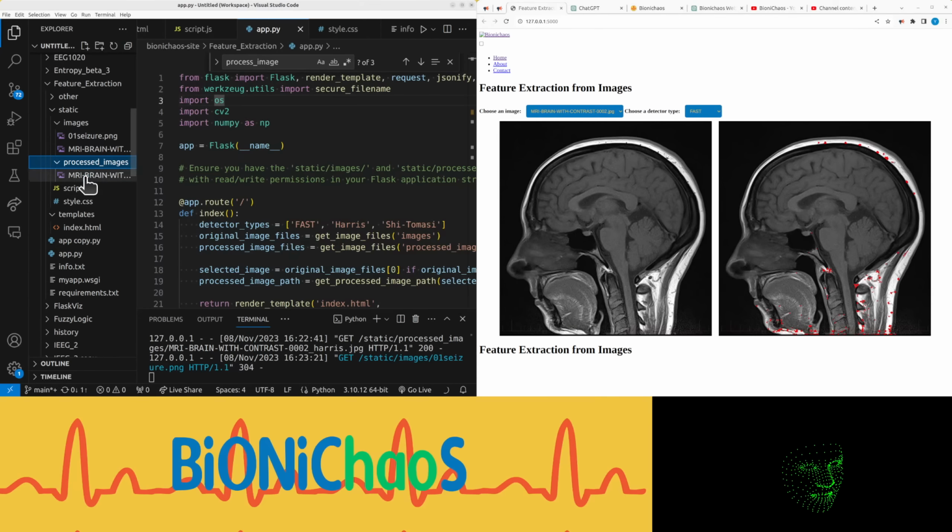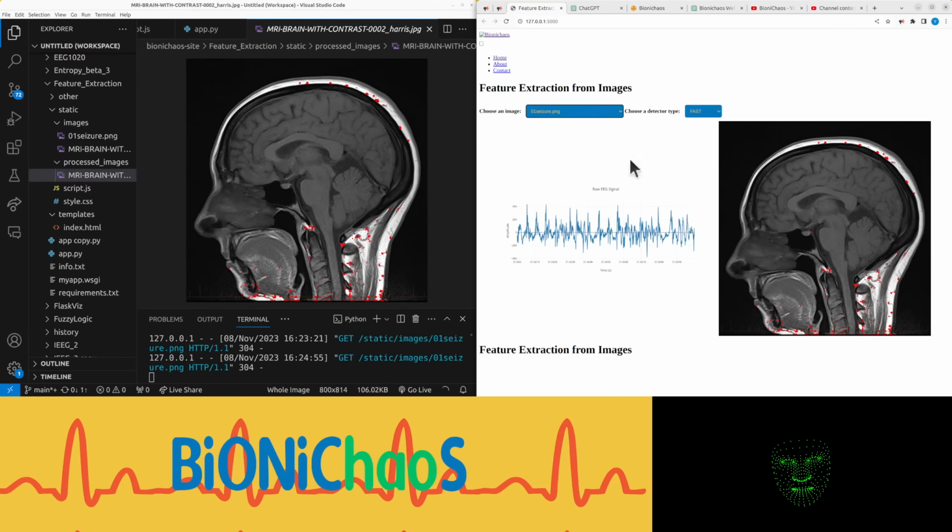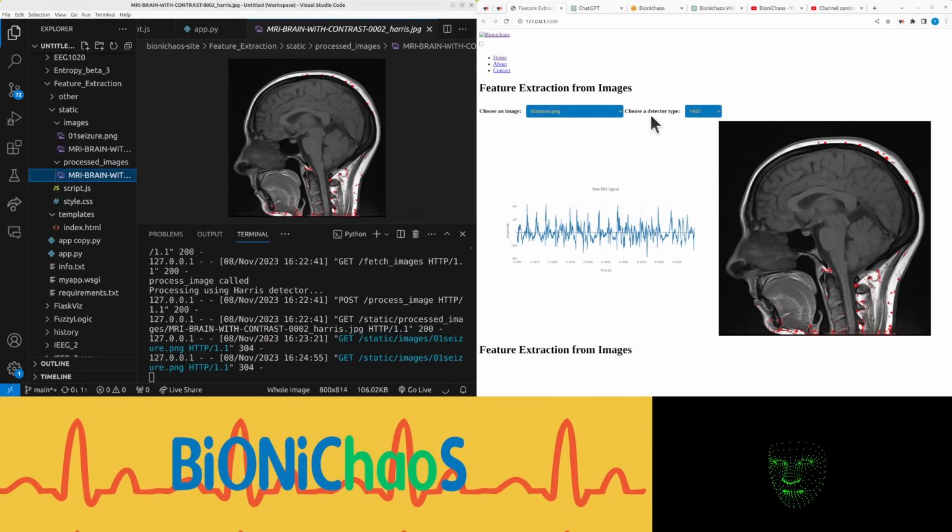So in processed image, we have that image generated in processed images. But we might need to make sure when we select a different image or different detector type, another image should be generated in this processed images folder.